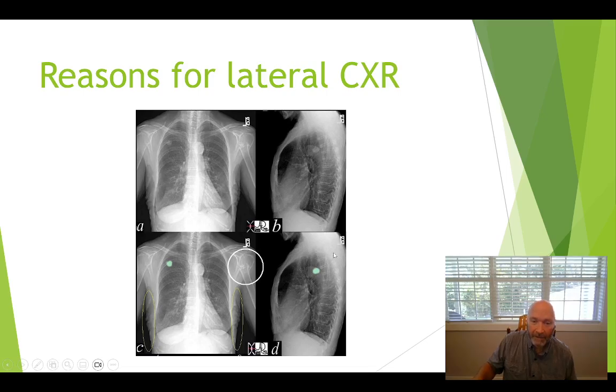If you were to take your lobes and just slice them across this way, you've got upper lobe, middle lobe, and lower lobe. And if it was down here somewhere in this area, but posteriorly, then you would have a telltale indication that possibly what you were looking at was lower lobe.